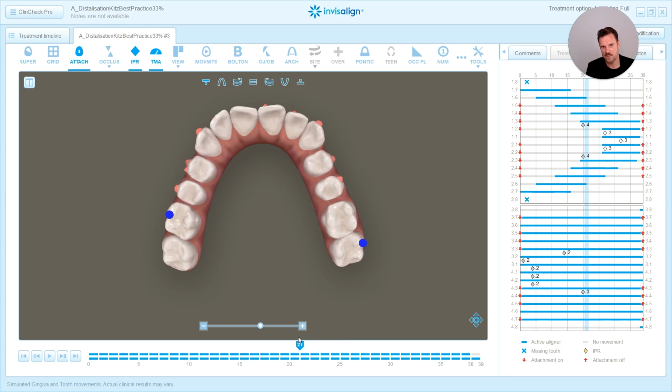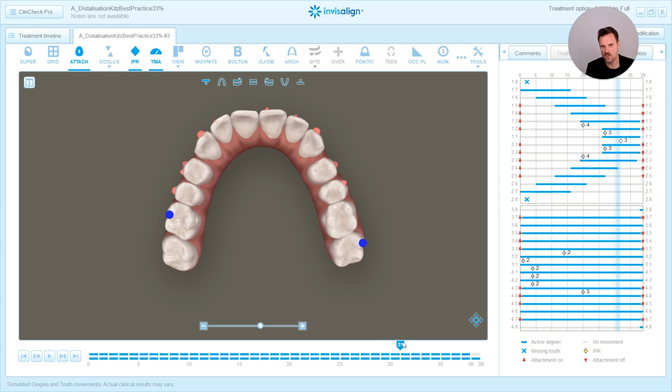So you can see that we move both premolars and the canine to the distal. And now it gets even more critical. We also move the anteriors with the premolar and the canine at the same time. And yes, this is very critical because we only have 3 teeth for anchorage for 4, and we know that we will lose anchorage here. So this is very critical, and we are very, very careful with these movements. And we also change this protocol to the 50% distalization.